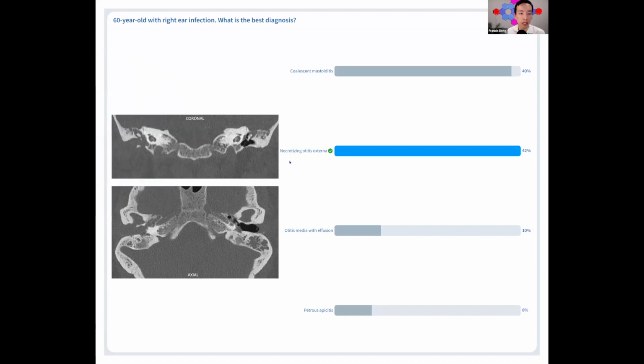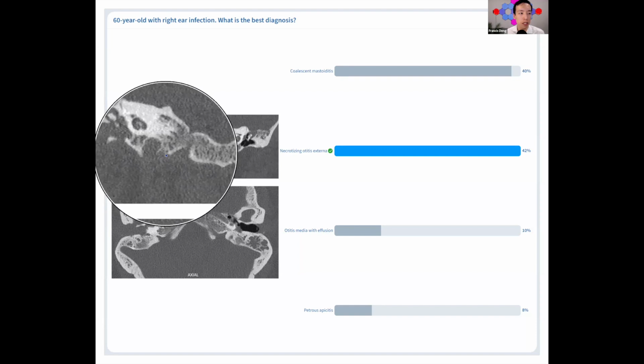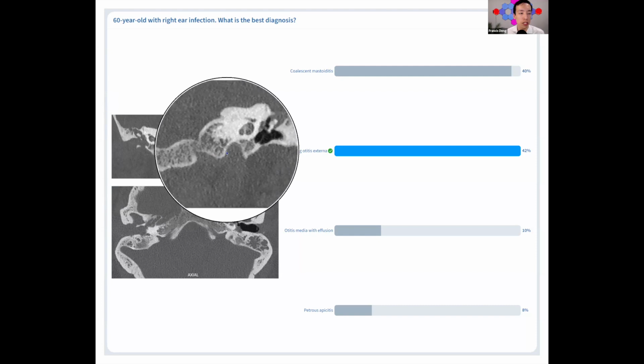These findings are considered due to erosion from their otitis externa. In addition, the sequela that develops in these cases is that the infection, once it has eroded through the bone, will then spread through the fascial planes underneath the temporal bone, below the skull base, and proceed medially, and will infect the bone more medially. That's when you can see subtle erosions of the inferior surface of the petrous temporal bone. So here we have lost the nice cortex over here. I tried to give you a very symmetric image so you know what the normal cortex looks like.